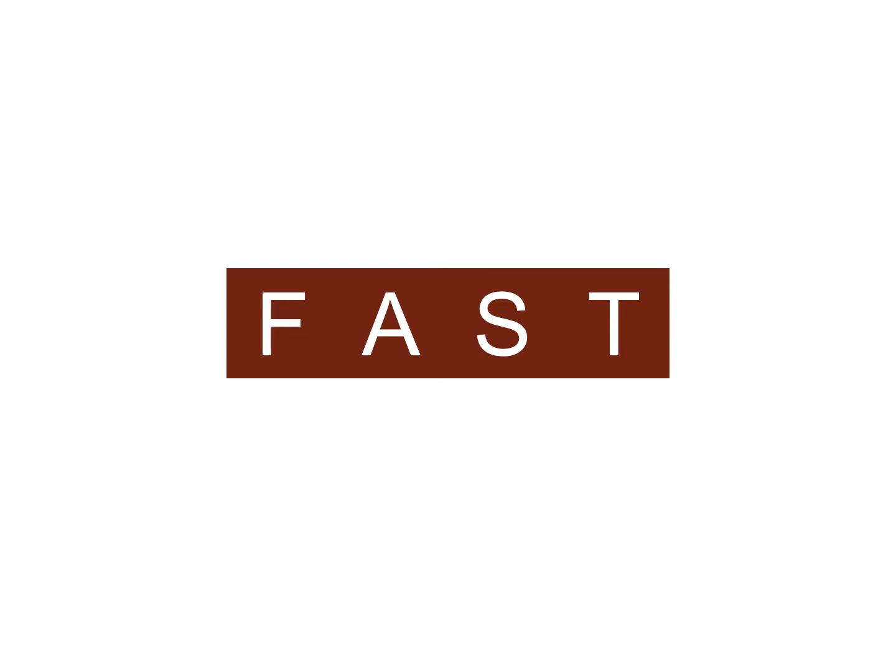All right, so let's talk about the FAST exam. The FAST exam is the study you are almost certainly going to do most often in your residency and probably throughout your career. It's a good exam to learn first because the views are foundational views. They're going to be very similar to what you're going to see in your renal scan, in your echo, in your OBGYN and lung ultrasound lectures that you're going to get later this week.